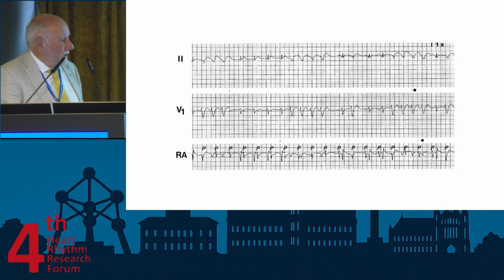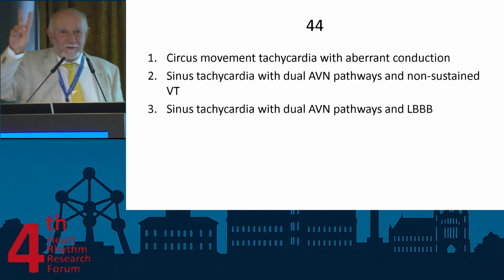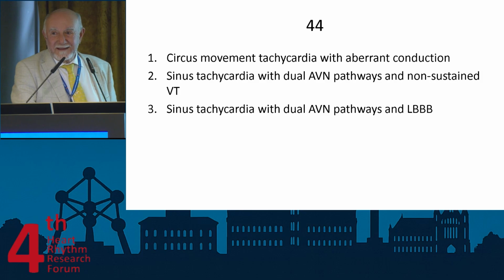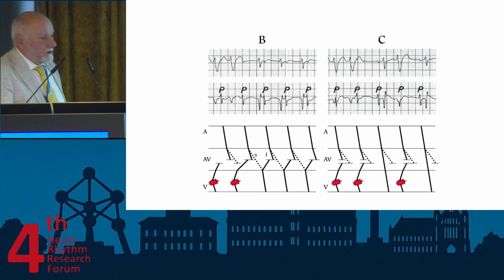Look at the relation between the P waves and the QRS complexes, the white ones, okay? I said too much, okay. Number 2. Who votes for number 2? 1, 2, 3, 4, yes, okay. Number 3? Okay, it's number 2. It's sinus tachycardia. You can see here 2 selected pieces.